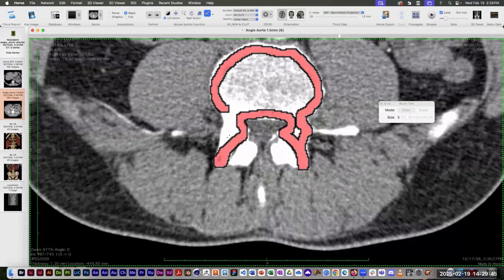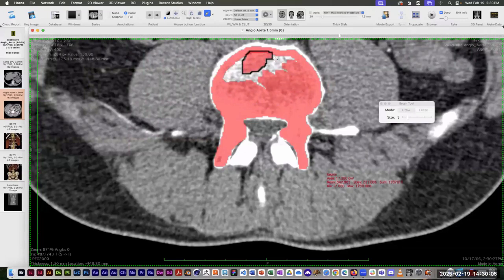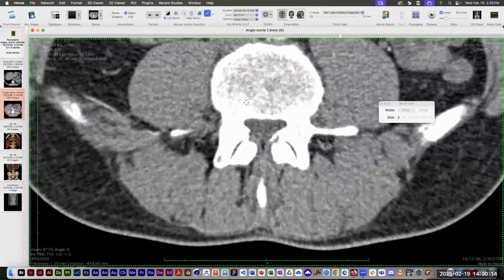One of the tricks that you have to use is even if you make like 27 different regions of interest, it doesn't matter, because what you can do is tell Horos to select all of the regions of interest in the same study, in the same data set. So if I click up here in this empty space, it's actually going to start creating a different region of interest. But again, it doesn't matter because eventually I'm just going to tell Horos to select all of them.